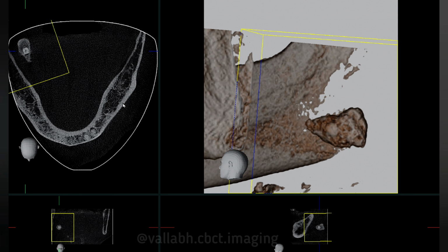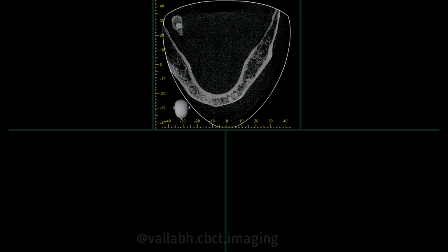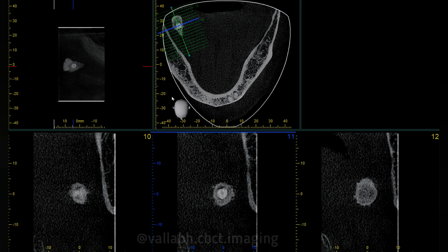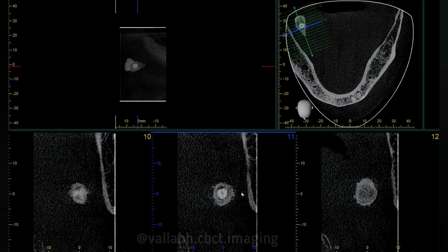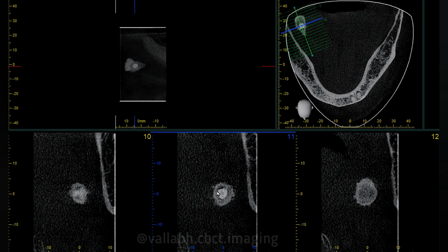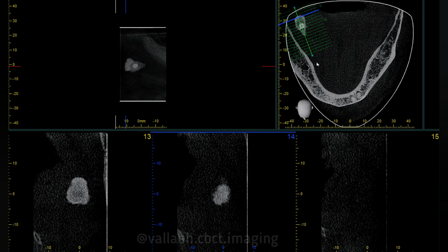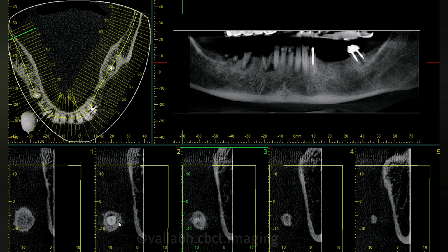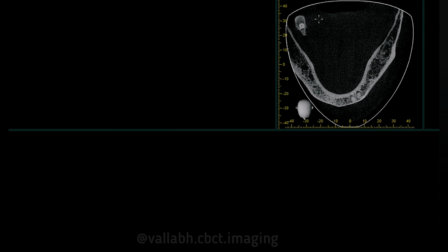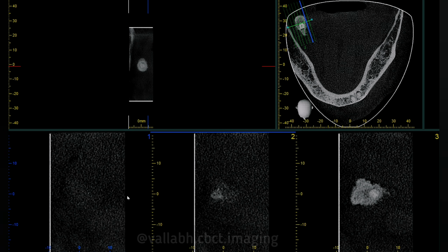Now if you want, we can study these in cross section format also. We'll see this over here, from the anterior aspect to the posterior aspect. The tip of the radio opacity is seen over here, this is a tooth-like mass, and the posterior most aspect. Similarly, the same radio opacity is seen here also. This is the posterior aspect, and this is the anterior tip, and this is the tooth-like mass. The same radio opacity can be studied in different interval lines, and there is a sagittal view radio opacity.